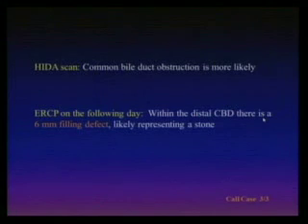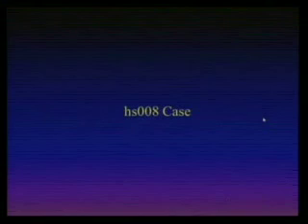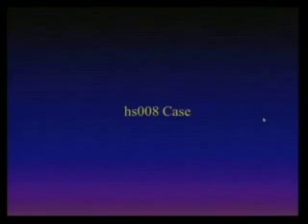No, with a cystic duct obstruction you see the CBD, pancreatic, and the intrahepatic ducts, right? Everything is normal except no gallbladder. This one, you do not see anything, just a very bright liver. So this is the ultrasound. You see the stone in the CBD, and then they did the surgery. And that's exactly an ER case.